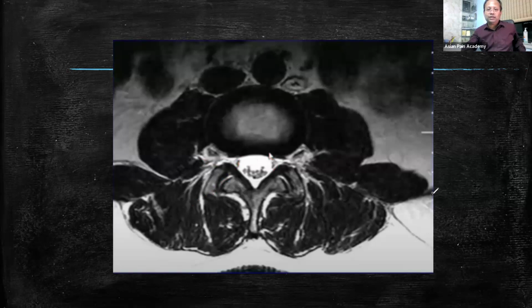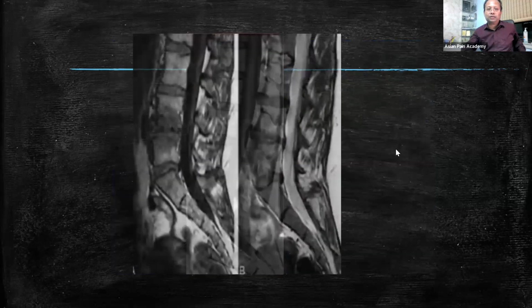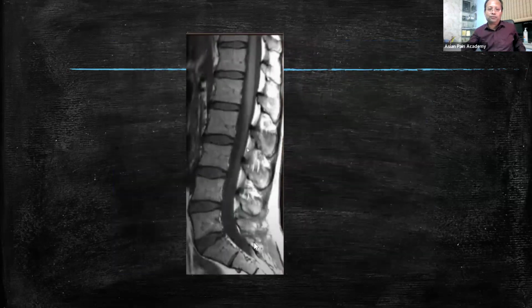Okay. I think for today, last one, two. Here, this question, this is which sequence and which section? Someone please tell me. Sagittal section and sequence.